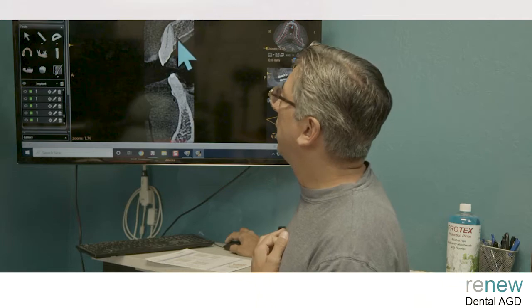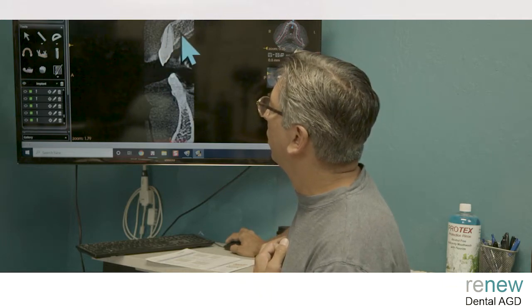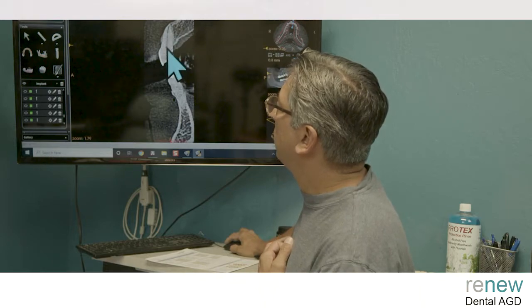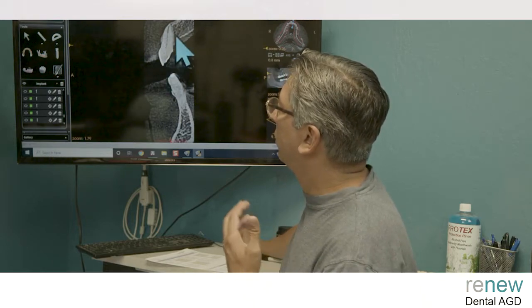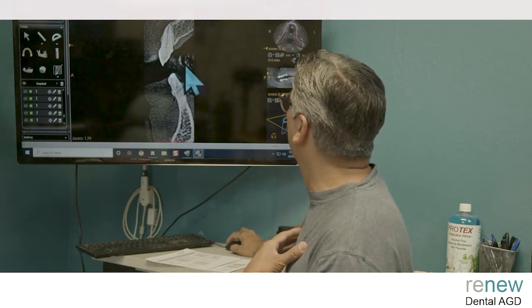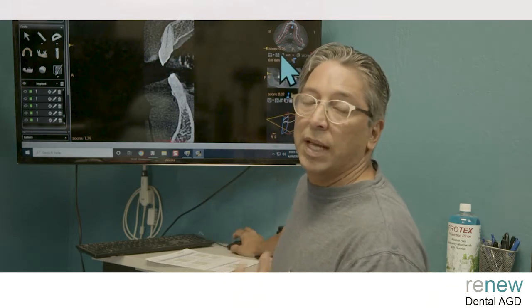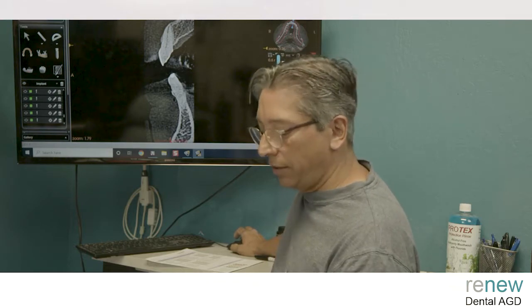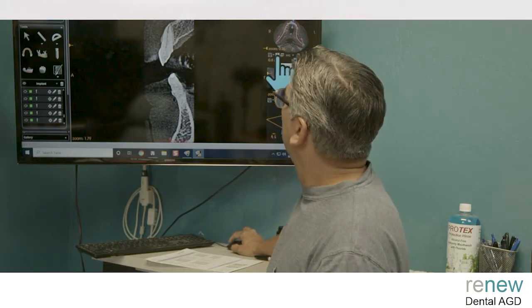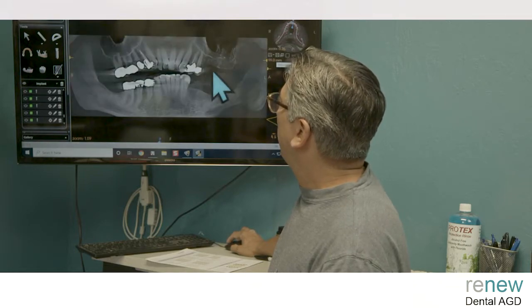But what I don't like is an angulation here, because your implant's going to have to go into the bone, and you'll try to keep it as angled as this to lessen the degree between the implant and the actual crown. So that's why I would say this is kind of an orange on the facial plate. So let's look back at what we're talking about.